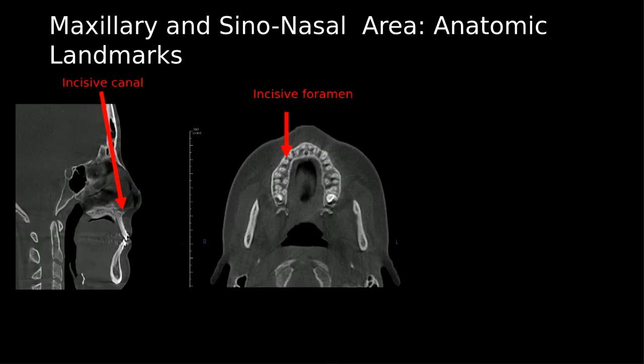And there's the maxilla; you can see the anatomy here. The incisive foramen is right here. Okay, that's the incisive foramen, and you can see the incisive foramen right here. In the exam I'll say, where's the incisive foramen? You have to point it here. And I do remember that I uploaded the PDF file. In the PDF file, everything is in the right spot. Okay, don't worry about that.